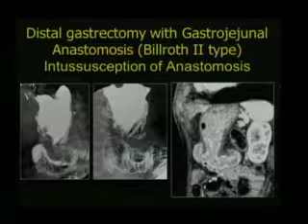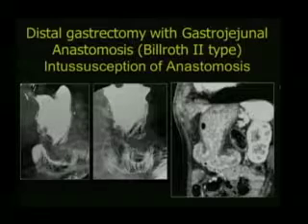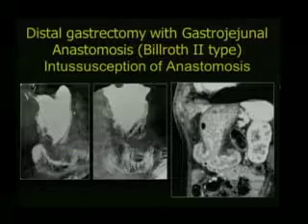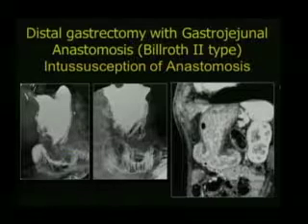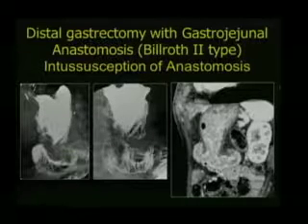So they performed a CT. And look at the CT. What is this filling defect due to? It's an intussusception. This is due to an intussusception that produced this filling defect. Look at the filling defect, some of the folds and things are normal. Yes, exactly. I agree with you. That was my mistake. I was obsessive. I said, finally I found a tumor. And I forgot that the folds were normal.